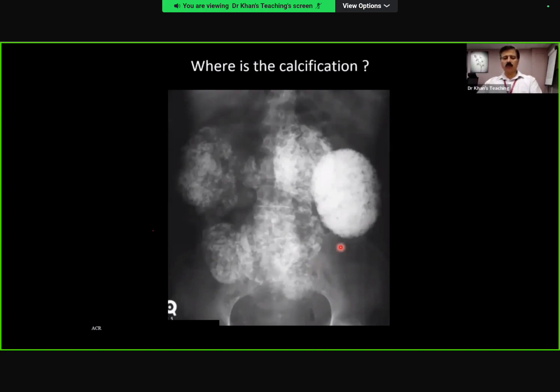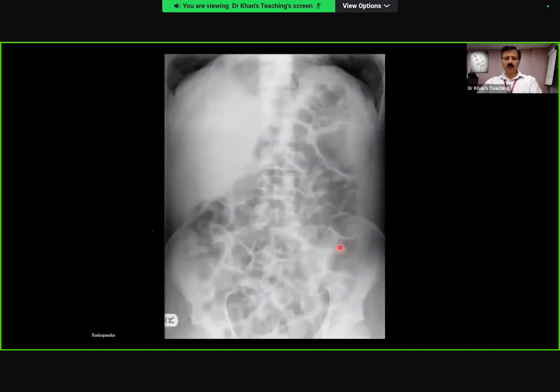And what I'm showing you is quickly just pattern recognition. So nothing more than that. Is there any organomegaly? Yes, looks like on the right side, upper abdomen, so most likely liver. Excellent. So these kinds of cases can come in the exam, and then from here, once you pick it up, the ultrasound might be shown to you or something else might be shown to you.